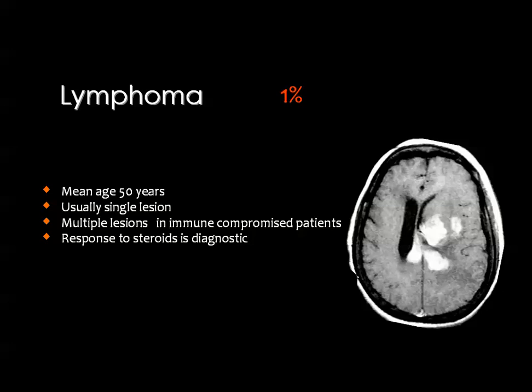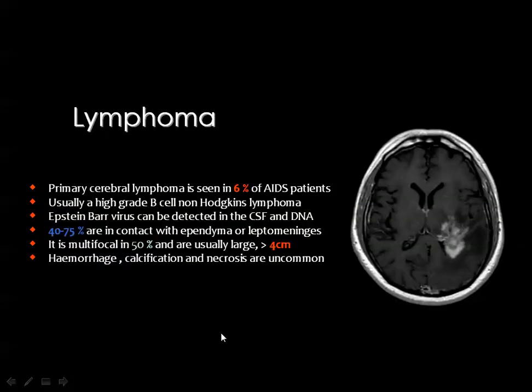Then we came to another lesion which is relatively rare compared to the meningioma, which is the lymphoma. And lymphoma is put into this category because of its homogeneous post-contrast enhancement. This lesion is a homogeneously enhanced lesion with no dural base, and this is one of the criteria of the meningioma. Meningioma shows homogeneous enhancement but with a dural base.